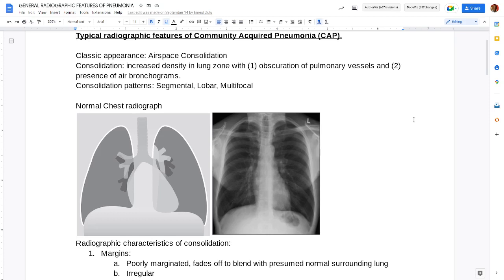The L is a metal, a dense material. There's a metal shaped like an L, which we use for analog. You put it on the cassette when you are taking the chest X-ray, so it is imaged together with the chest. It is also imaged onto the film so that you identify which side is the left and which side is the right. For digital X-rays like this one, of course, you actually just type an L and paste it there.